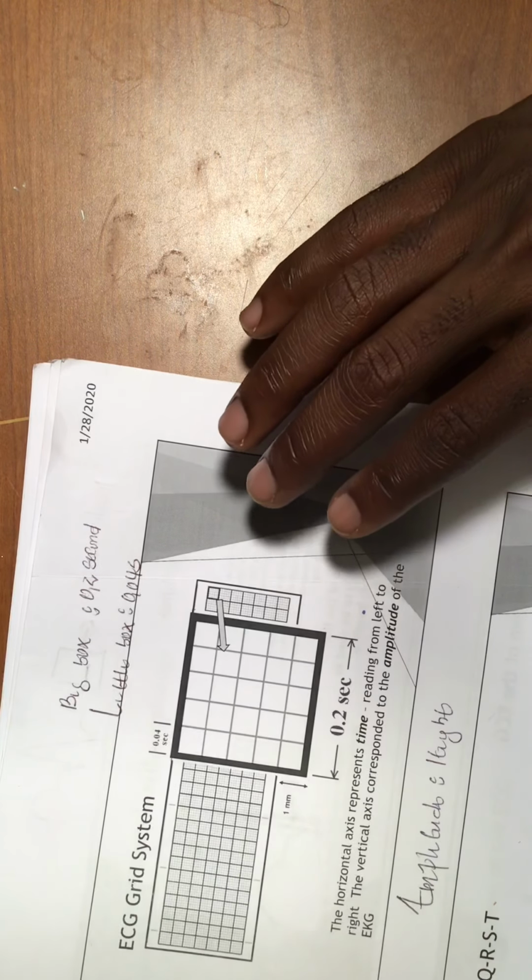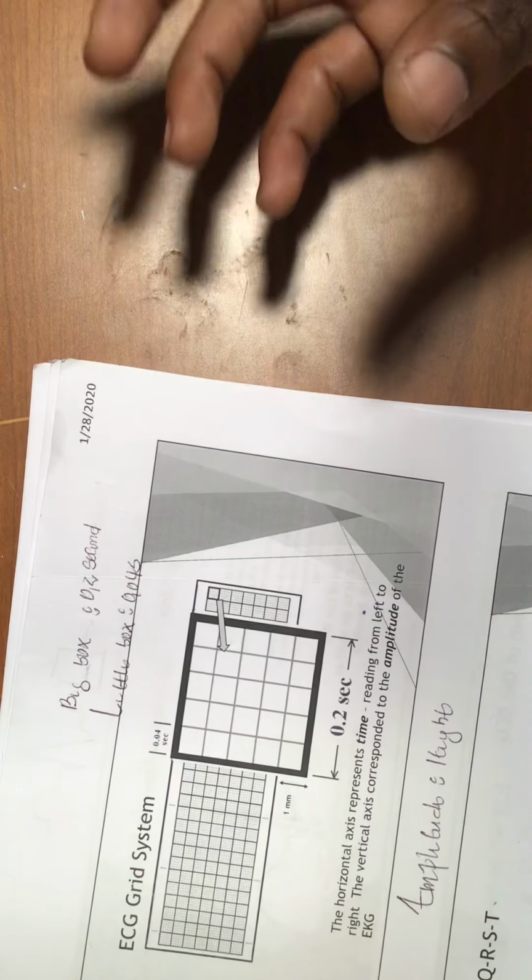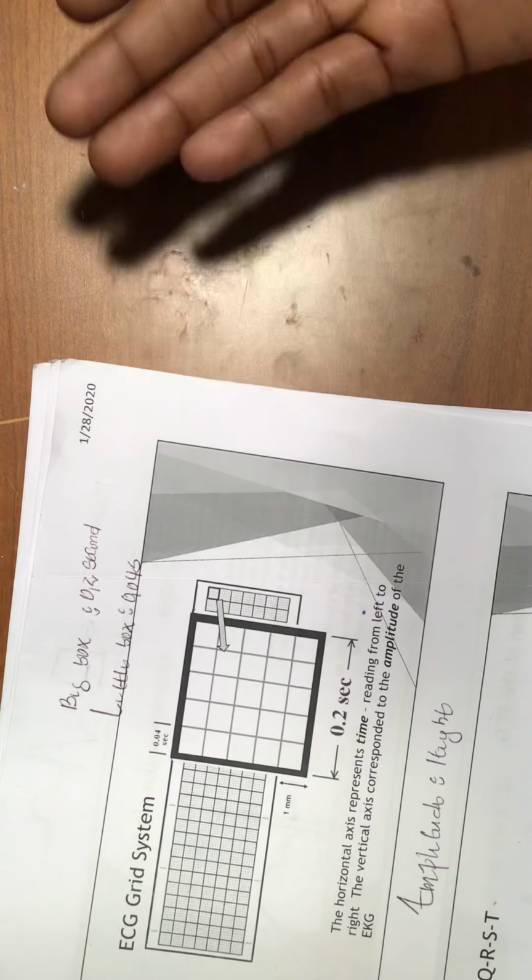Those are really important to know, because if you're not reading an EKG on a computer and you only have a strip in your hand, meaning a strip from someone who has had all the leads put on them, like the tele, to get an EKG, or I mean to see the activity of that person's heart.